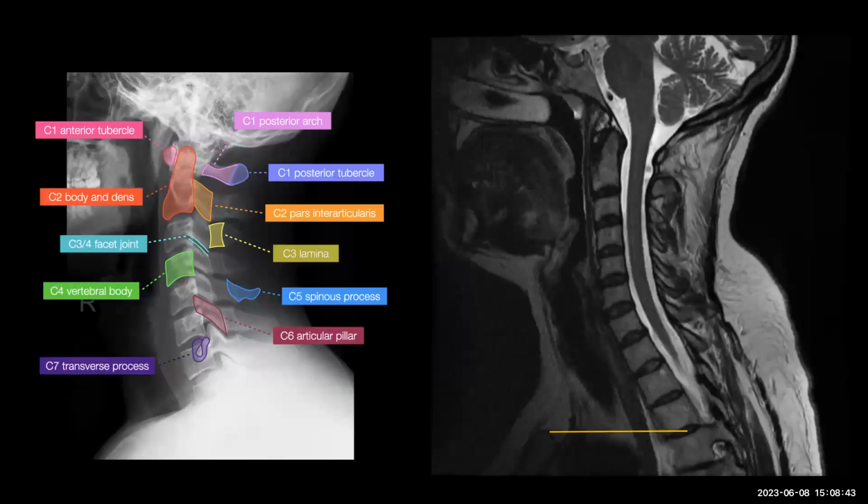The other way to go about this is, if you have radiographs, they're always useful. You should always have a complete look at the imaging that is available to you. So again, you might have a cervical spine and then a thoracic spine, and mostly these are done separately. One of the easy ways is to take a landmark, which is the upper end of the sternum. So if you count 2, 3, 4, 5, 6, 7, 1, 2, 3, the sternum is at the disc space between T3 and T4. So when you start counting at the thoracic spine, when that's available, at least you have a landmark from where you can continue to measure the vertebral bodies accurately.